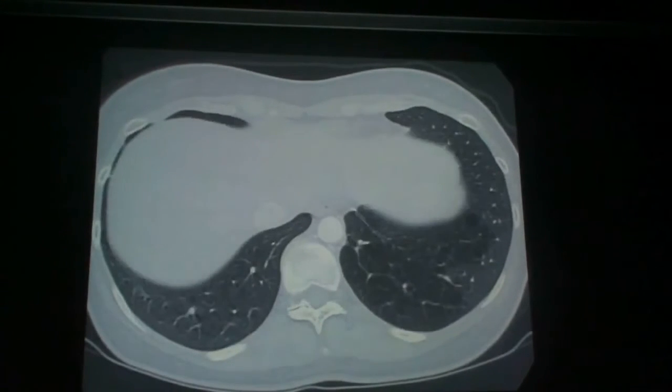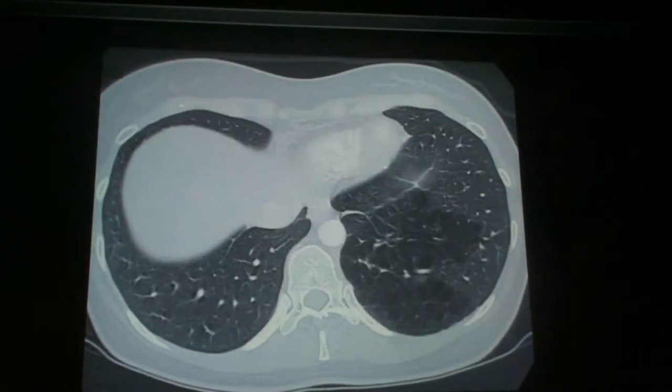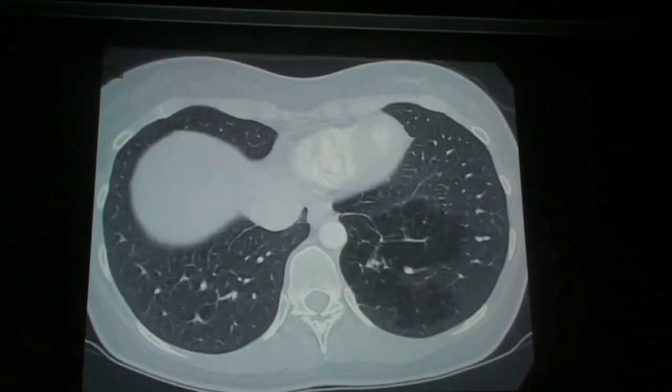Indeed, it is a pulmonary sequestration. And another abnormal finding here is the lung parenchyma, which is not normal in the left lower lobe. You can see here hypoattenuation, and this is partly due to emphysema and partly due to air trapping, because you will notice that the bronchi are missing. Here you can identify the posterobasal bronchus, B10, and here you can't.